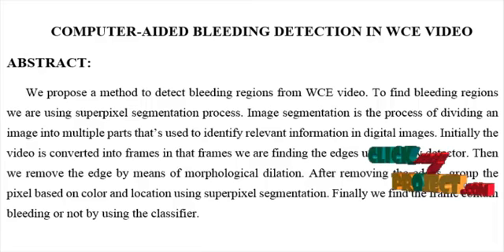The size of the video frames varies depending on the video format and the file format that we are proposing. The video is read and the median filter is applied for the unwanted noise removal in the videos. After that, the smoothened images, which are the result of the median filter, are then used for the next process. The edges were detected using canny edge detection methodologies.